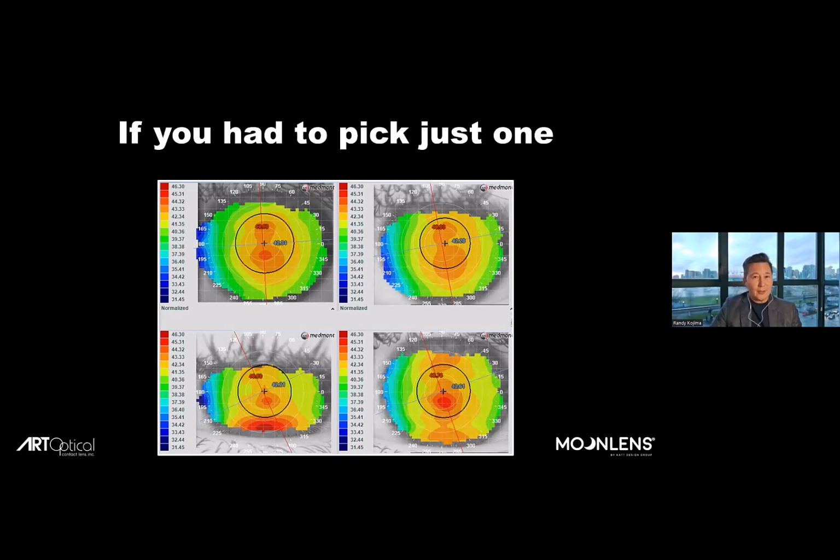And I might encourage you to select the upper left image. It's the closest to an hourglass figure 8 astigmatism that we typically see in a normal astigmatic eye. Certainly the bottom left image shows the fissure size has been squeezed down. All those eyelashes are probably creating shadows that are hindering the accuracy. You've got a big red area inferior of center. This spot right here, that's probably due to the tear wedge. You can see some of the rings have started to look more horizontal rather than concentric all the way around.